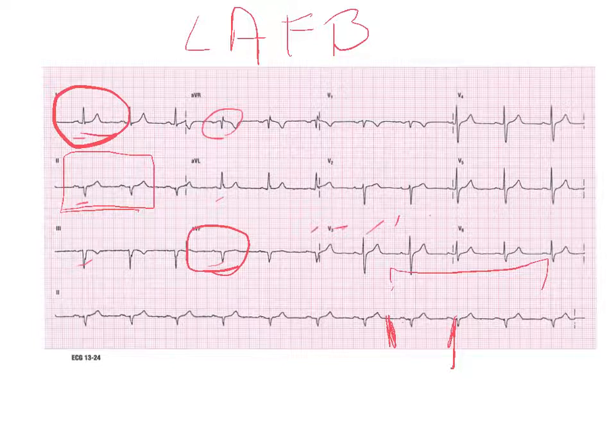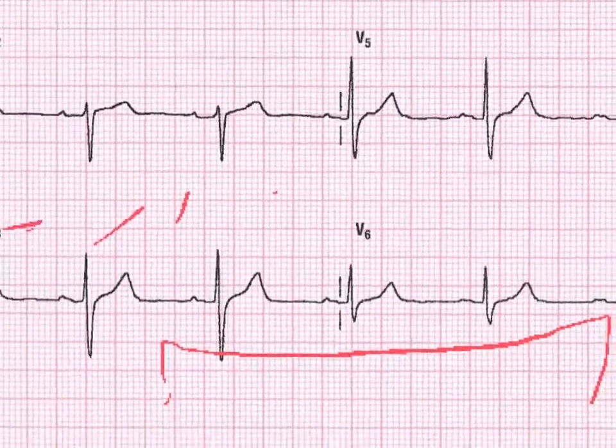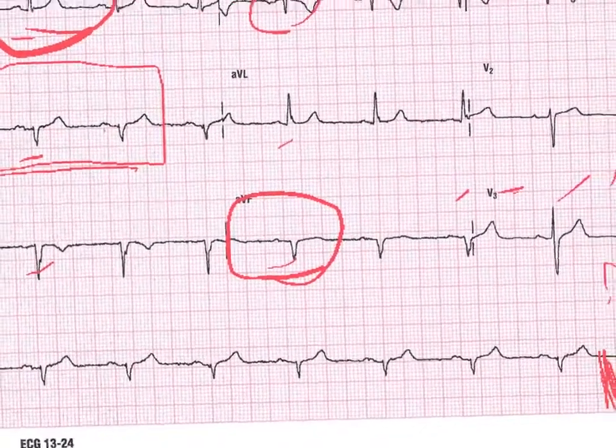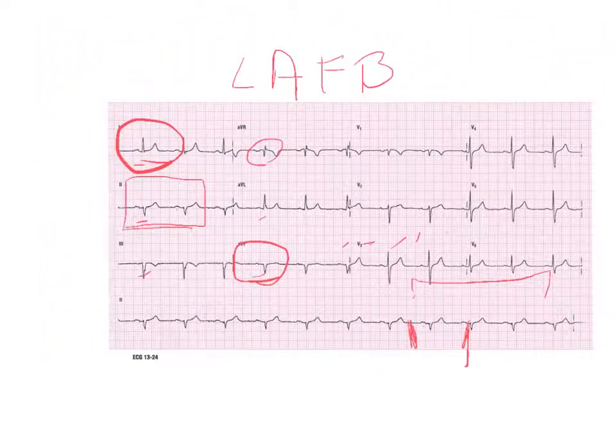And so that's RPM AB, and now we're going to look at C. We're going to look at changes. And do I see any strange looking T waves? Do I see any deformed upslope on any T waves? And I don't. Do I see any ST elevation or depression in any of the leads? And so really, I don't see anything on RPM ABC. The only abnormality in this sinus rhythm would be a left anterior fascicular block, possibly. So that's RPM ABC for case 1.